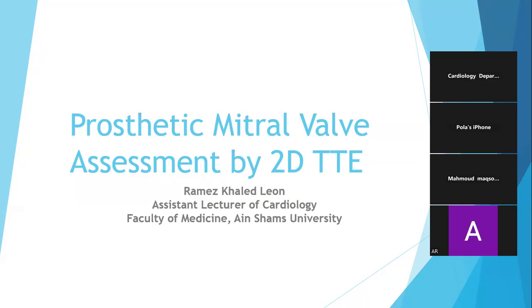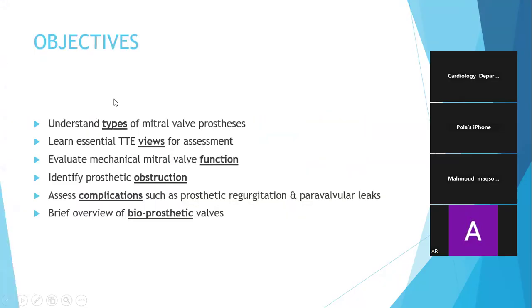This is a case presentation regarding a prosthetic mitral valve assessment by 2D transthoracic echo. These are the objectives. Quickly, we will go over these items.